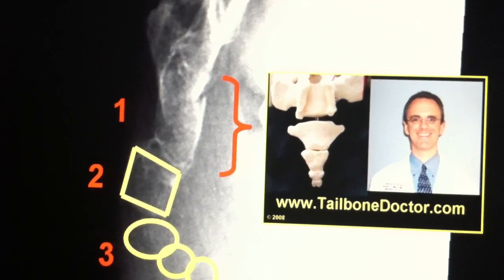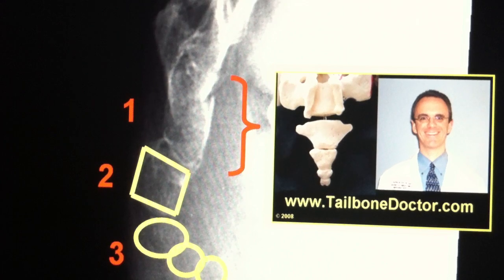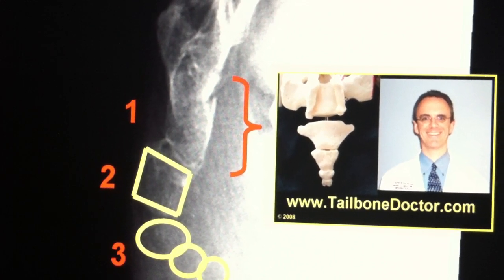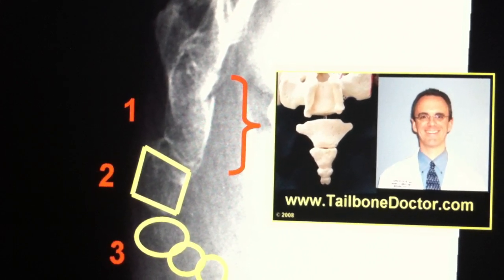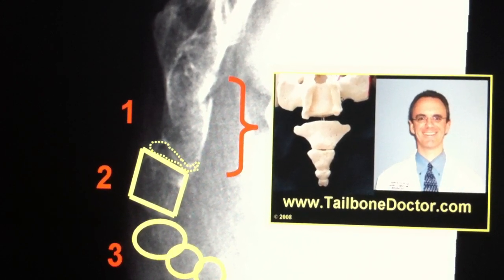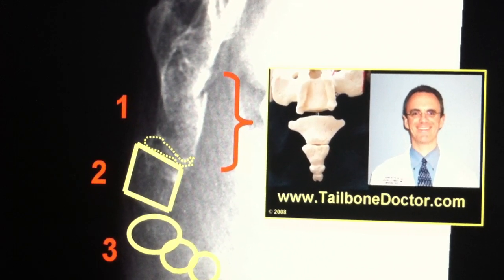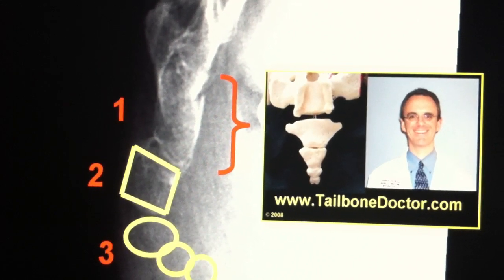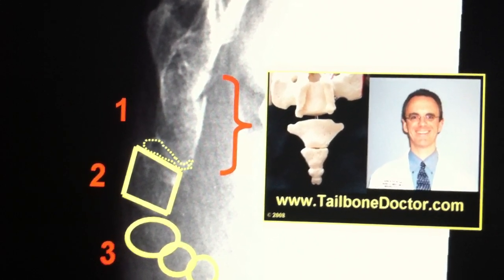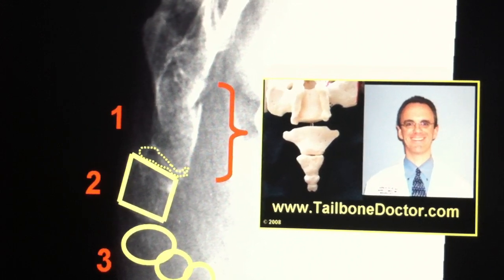Okay, so as I try to outline that, one of the things you'll see is there's this lower segment down here that just does not look right. There's not one nice, crisp, clean joint for the bone where it meets with the next bone. It looks like you'd have to question yourself as to which is the bony articulation, the dashed line above or below.